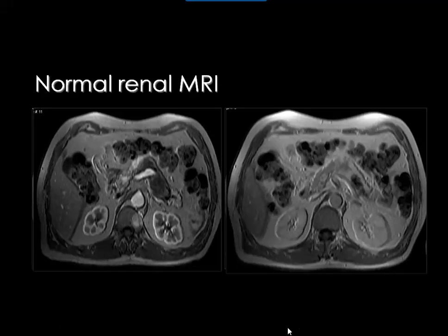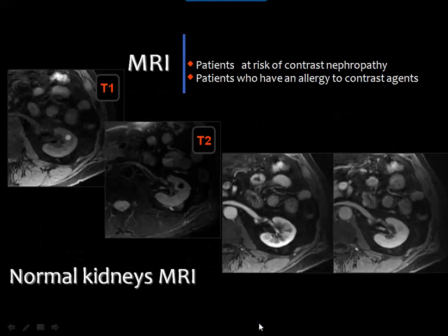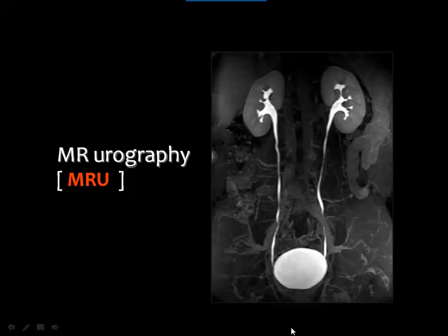After injecting contrast media, you may have the triphasic study showing the corticomedullary phase and the nephrographic phase, as well as the excretory phase, or you may simply inject contrast media and have the combined nephrographic and excretory phase. For MR examination, we should have the T1 weighted image, the T2 weighted image, and the post contrast images. Then you see a cyst in the kidney, which is bright in the T1 and less dark in the T2, denoting the presence of some hemorrhage inside.